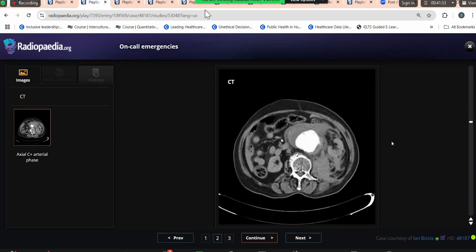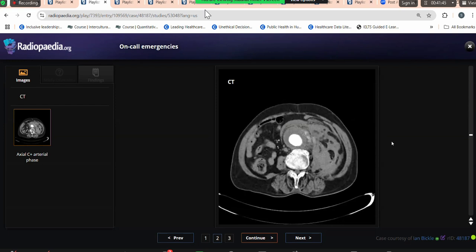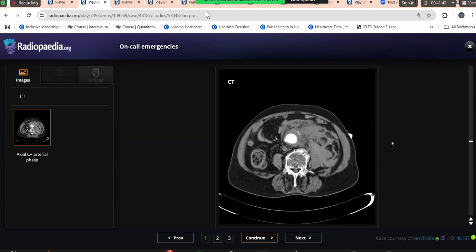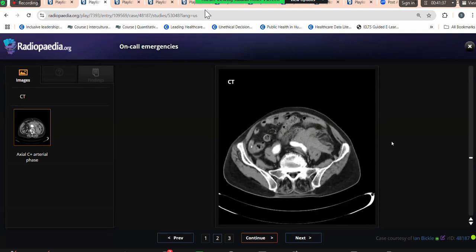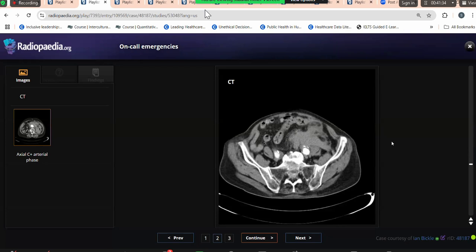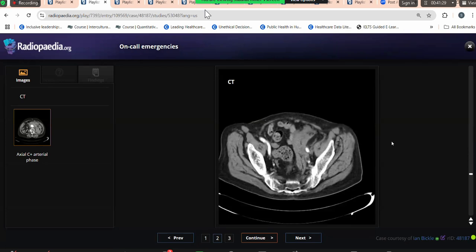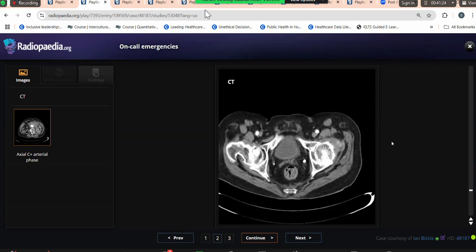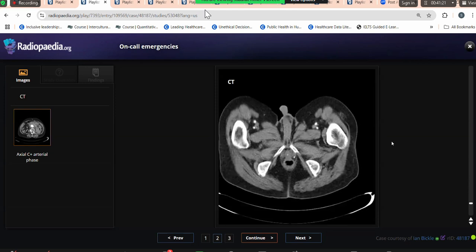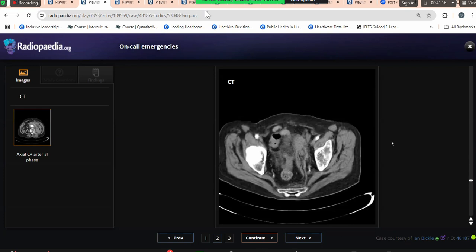There is also abnormality involving the abdominal aorta, and it appears dilated. I cannot see any filling defect within the aorta. Below the aortic bifurcation, that abnormality on the left side is continuing into the pelvis along the iliac vessels, and in the pelvis the urinary bladder and the region of the rectum appear normal. I would go back to that abnormality.